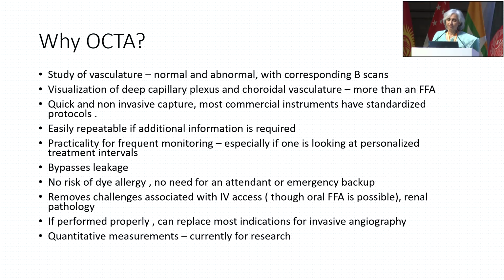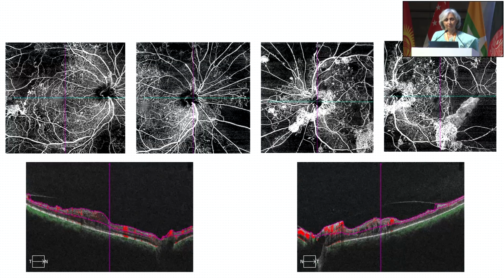There's no risk of dye allergy, no challenge with IV access. If performed properly, it can replace most indications for invasive angiography. And quantitative measurements are possible, but currently more as a research tool. And this is not a fancy OCTA machine. This is a regular 12 millimeter scan on a standard SD OCT.